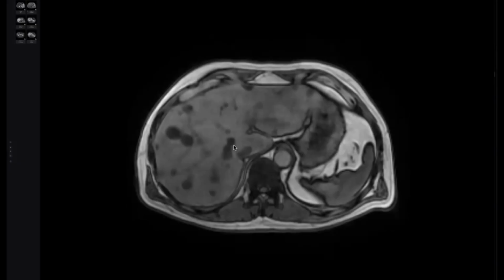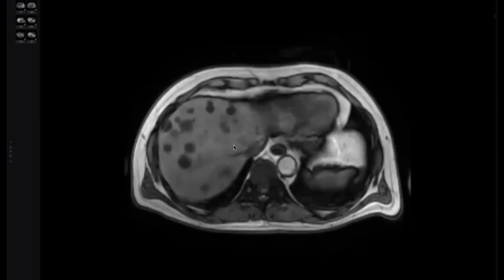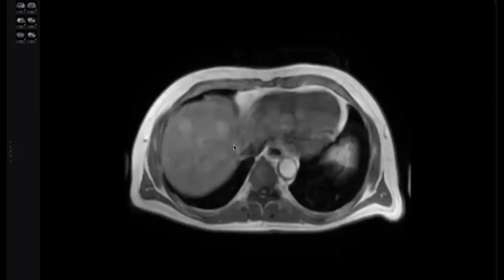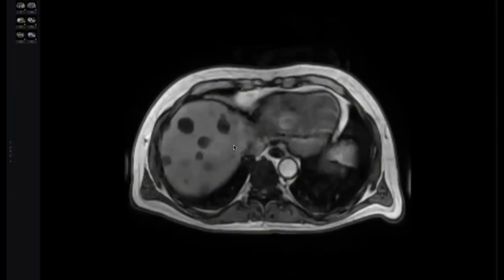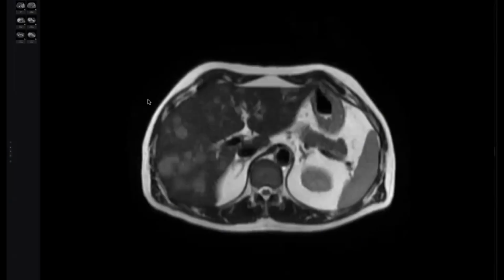Thank you, Dr. Nashwa. You did very well. You were very logical, but you forgot T1. My colleagues, T1 is essential, especially when you are seeing a lesion, you should at least exclude hemorrhage or fat. I will give you very good tips here.